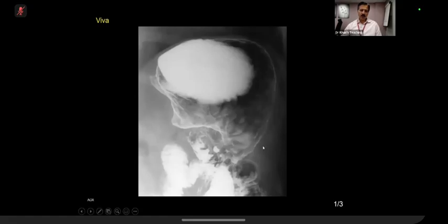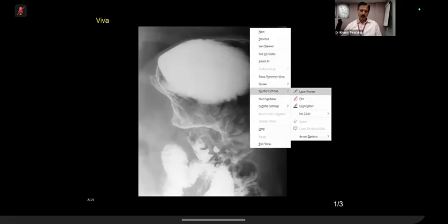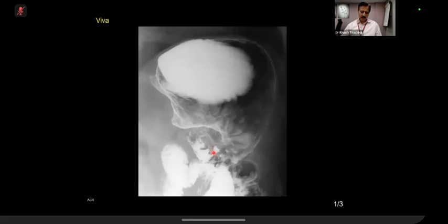Yep. Now, if you see here, there is something else. This pooling here and pooling here. By the way, before I take over, can you stretch your imagination? What will be this thing? I can show you a profile image for this also. Here you are. They're going out. These are small diverticules from the jejunum or pseudodiverticulum.